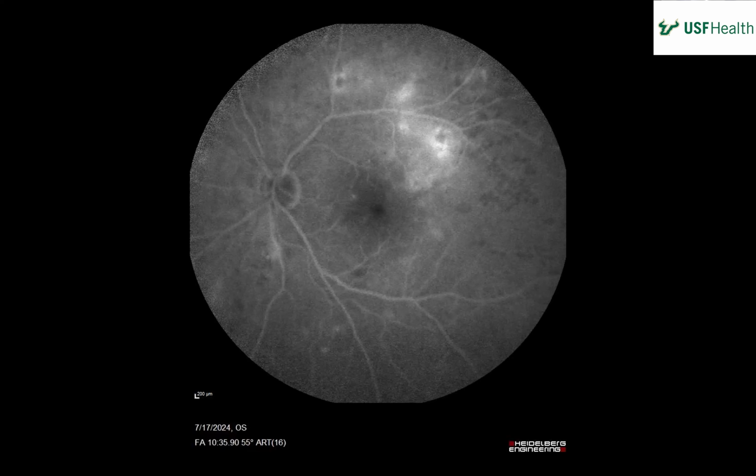It was just remarkable how, in other people where the fluorescein showed nothing, the OCT showed this giant fat retina. The disconnect between fluorescein and OCT is interesting. Okay, so Dr. Cohen kind of asked me to disregard that direct portion of it. And this is Dr. Fowler's case, I think, just to give him credit. Kind of focusing more on the pigmented areas.